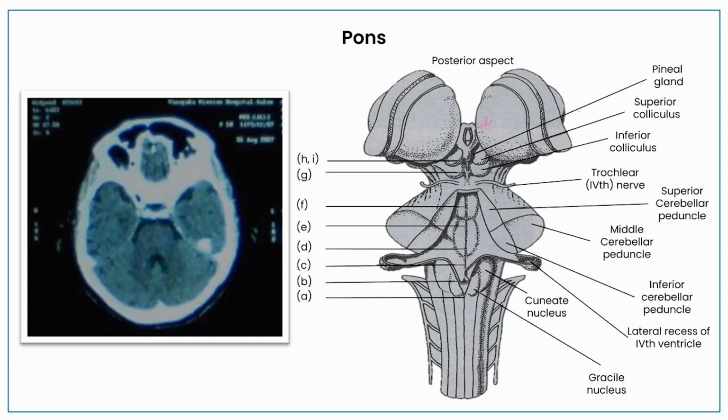What you are seeing here as this horseshoe image is what you are seeing in this image as the middle cerebellar peduncles. So obviously, the part of the brain which is connected through the middle cerebellar peduncle is pons. If you see an image like this which resembles a tooth and an enamel, it is nothing but your pons connected to the brainstem and cerebellum through your middle cerebellar peduncles. That's the structure which is quite easy to identify in a CT scan. So once you identify pons, it becomes much easier for you to identify the rest of the structures.